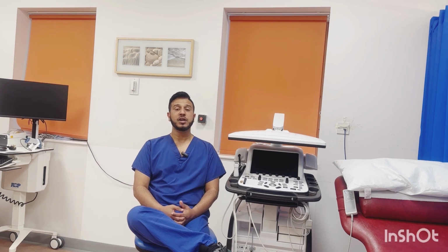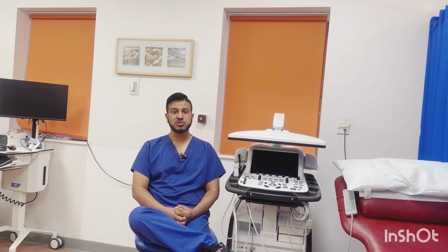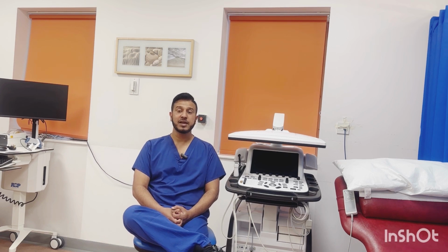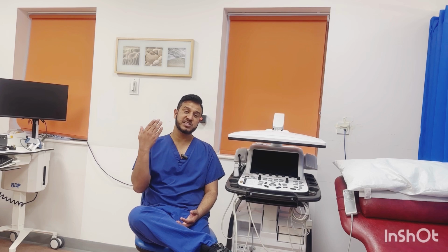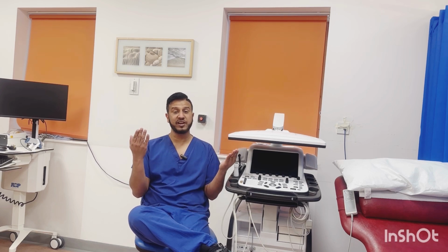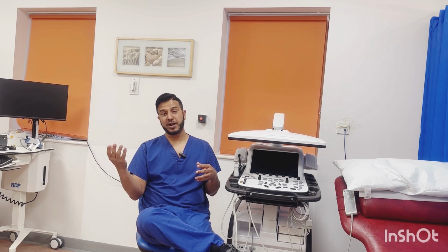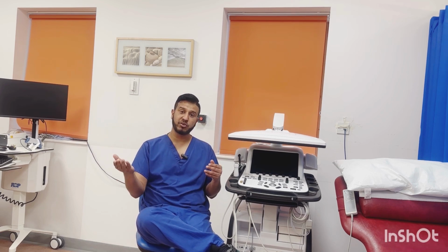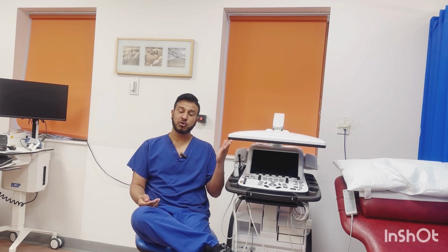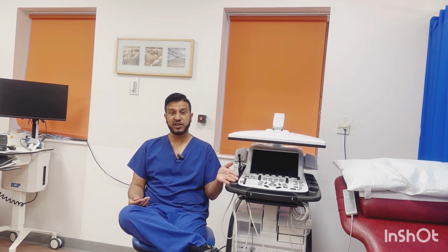Abdurrahim here with you. So we are continuing our aortic stenosis topic, and today we are going to learn a very important aspect of aortic stenosis. As I told you in the last vlog, sometimes we can have discrepancies between our findings and also the gradient of the aortic stenosis. For example, some of our parameters, like gradients, are suggesting that this is moderate or mild aortic stenosis, but our valve area is suggesting that this is severe aortic stenosis.